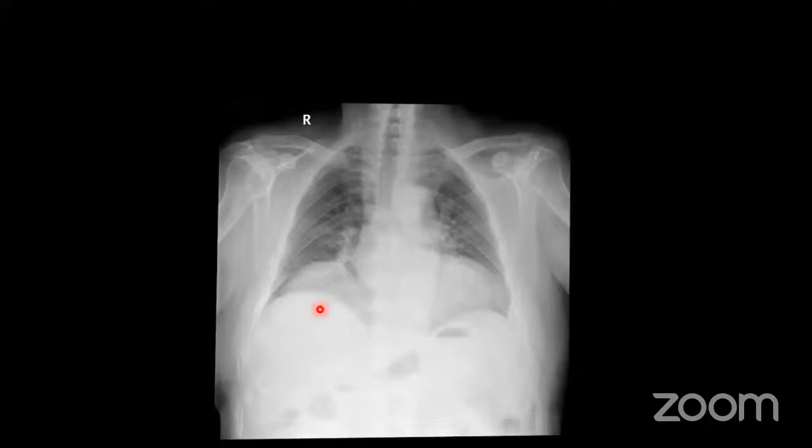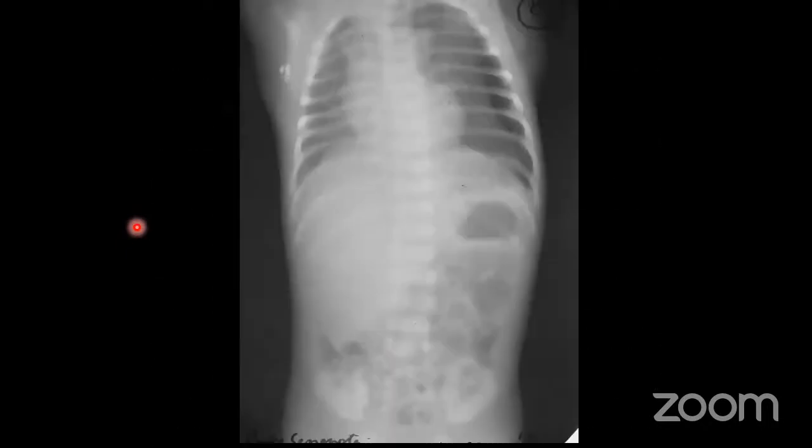The difference between diaphragmatic eventration and diaphragmatic paralysis or weakness is that in eventration, only a part of the diaphragm is involved. In diaphragmatic palsy, the whole diaphragm is involved. If bilateral diaphragmatic eventration is there, Werdnig-Hoffmann disease and some congenital infections like toxoplasma should be considered. But unilateral hemidiaphragm can be seen in the trisomies and even in other syndromes like Beckwith-Wiedemann syndrome. So this is a partial eventration.